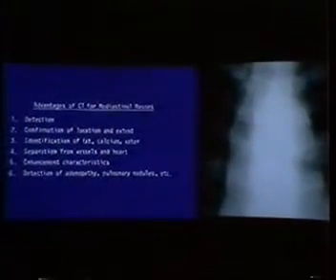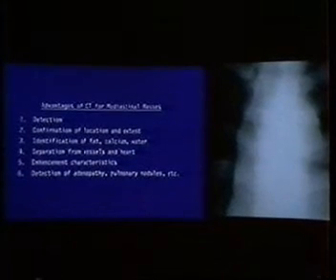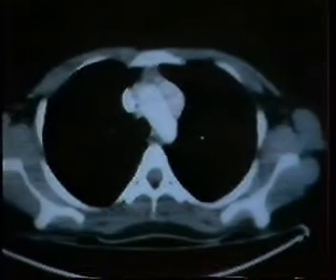Enhancement characteristics may also be useful in your differential diagnosis, certainly something you can't tell from this plain film, although there was a suggestion that this was abnormal because in a young patient, I think she was in her 20s, there looked to be too many contours and too much prominence in the region of the aortic arch. The reason is that there was a mass sitting right alongside the aortic arch.